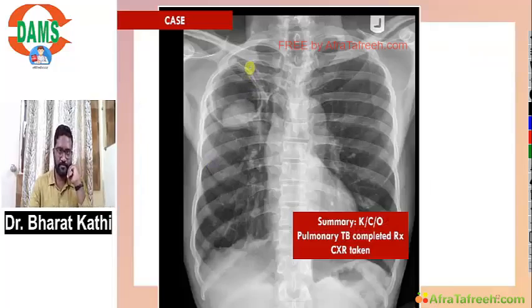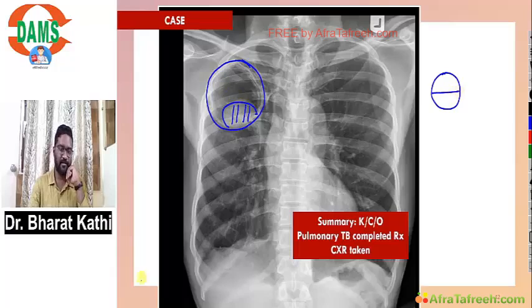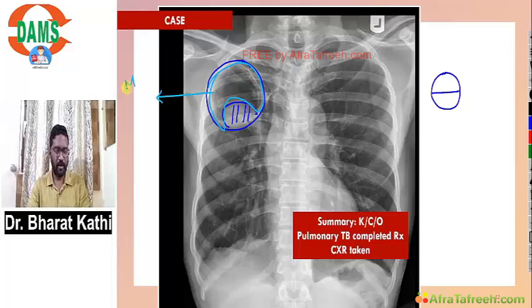Here also there is a cavity and there is something white like this. But if you notice, in lung abscess it was a straight level, but here it is curved, and you can see air around this as a half moon shaped structure. So this is also a crescent sign, but to avoid confusion with the classical air crescent sign, what is this referred to as? So this is called as Monod's sign.